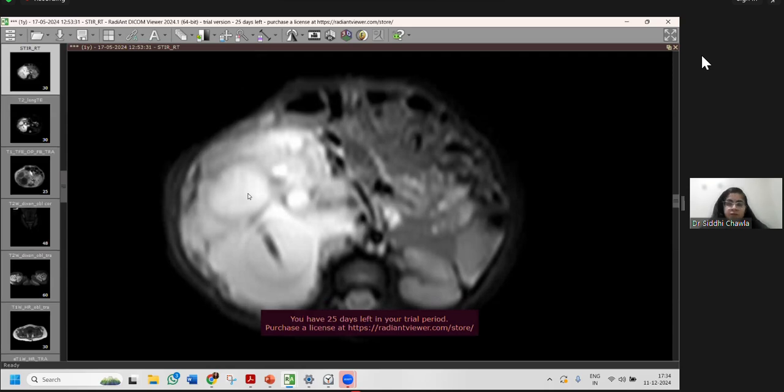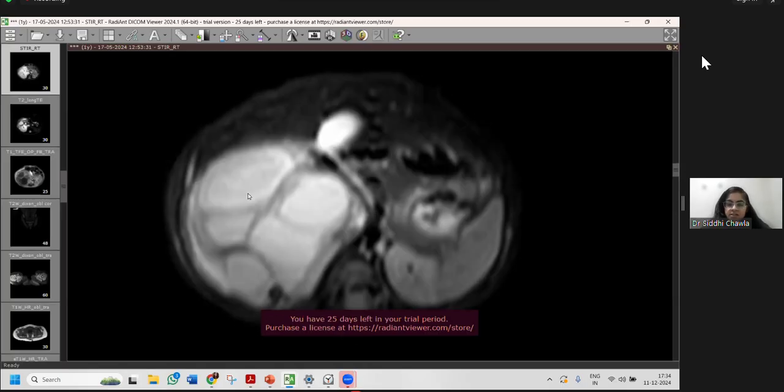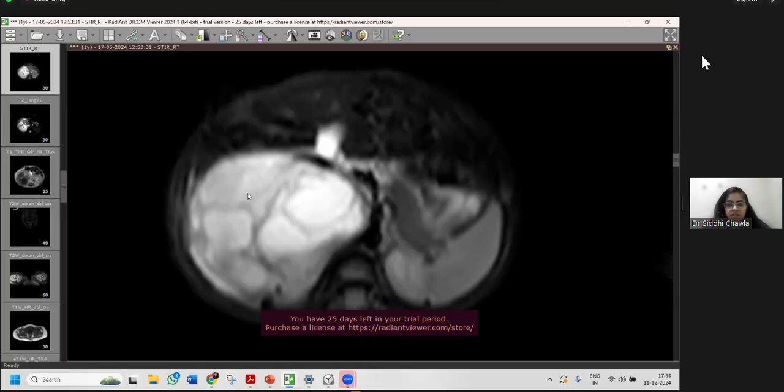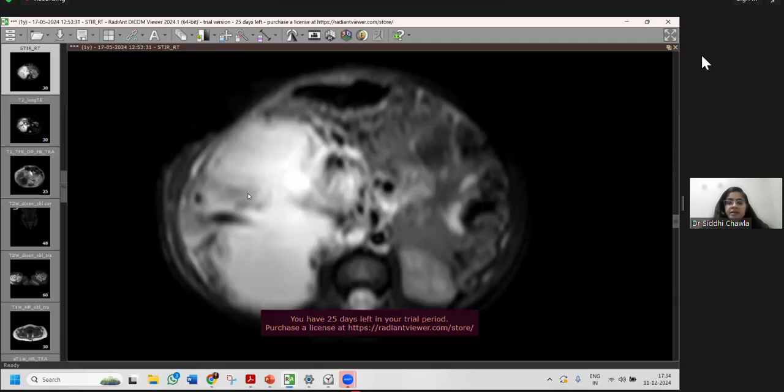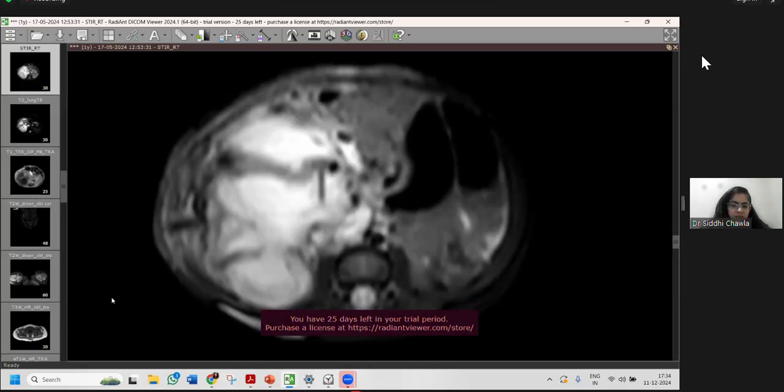You can insert it if you are considering a lymphangioma. Hydatid also does not have to be intervened on like this, but in this patient, this tube was put, and it served no purpose other than rupturing the mass lesion, and eventually this pigtail had to be pulled out. So this is what you have to avoid.